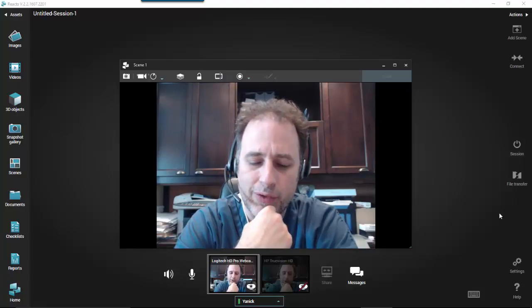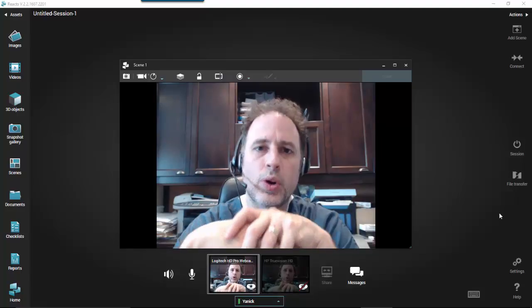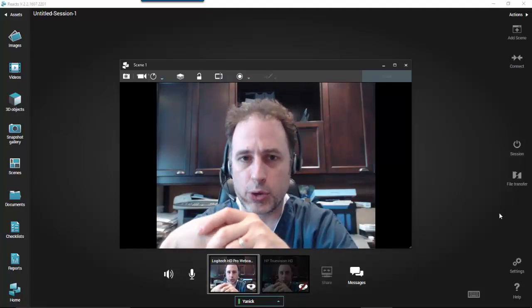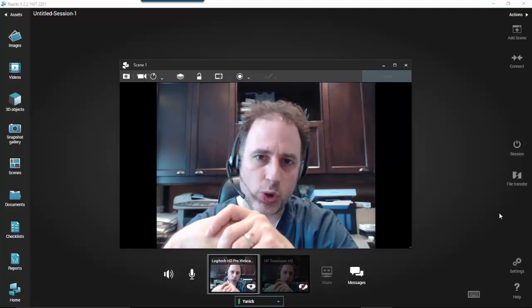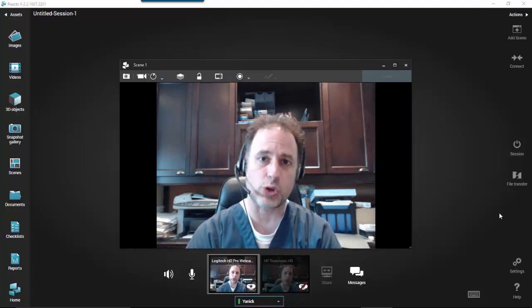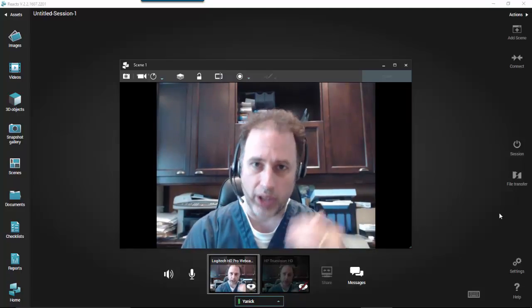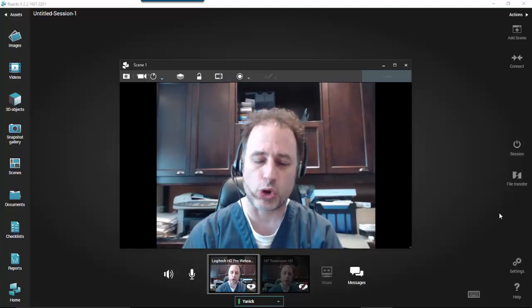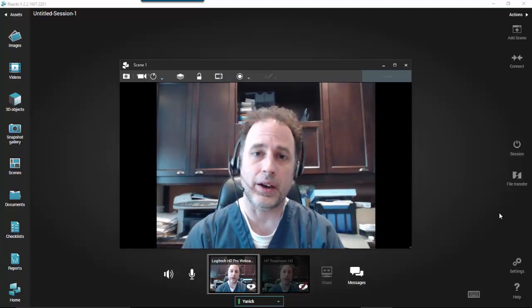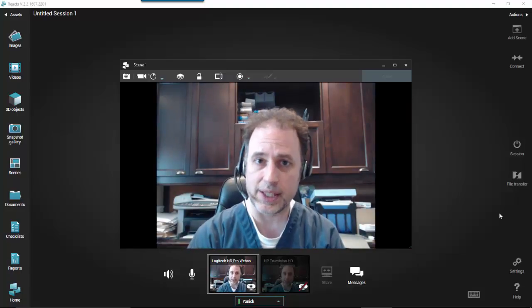What I will be doing today is a fairly brief demo of the Reacts application so that you can see the main uses and how it can be used. I'm going to start by showing you a few things offline, what happens when you start the application, and then we'll connect with a colleague of mine who's at an outside office, and we'll do a demo showing you what's happening on the screen. Hopefully this will give you a pretty good understanding of the application and all the capabilities.